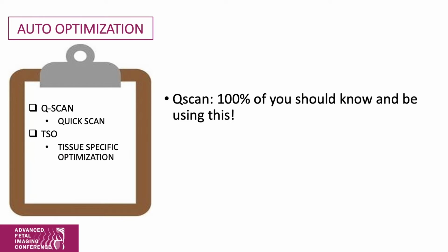So the first two concepts are Qscan and TSO, or tissue-specific optimization. Everyone who can operate an ultrasound machine at this conference should be extremely well familiar with the Qscan. This includes both sonographers and physicians. You may not use it 100% of the time, but you should be incorporating this into at least one portion of every single scan that you do.